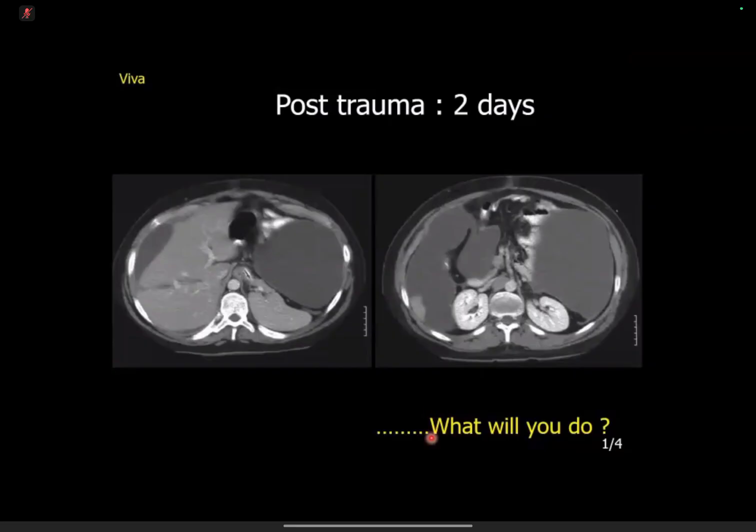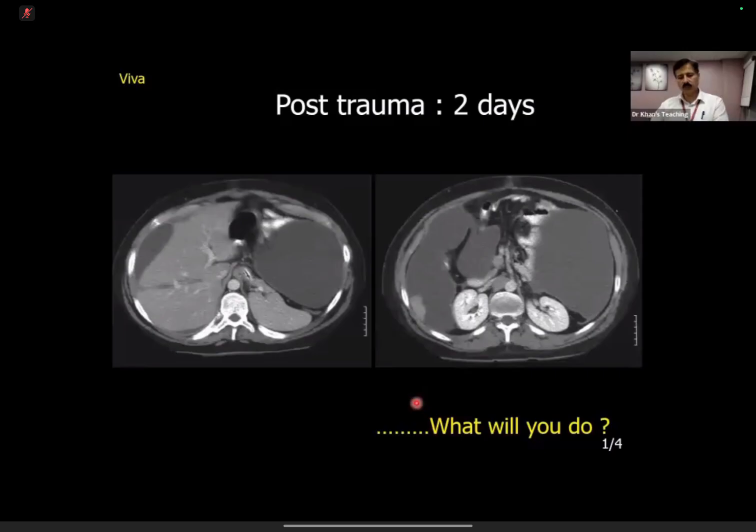the density of the bleeding is not that. After 2 days, obviously in my day-to-day practice, I would check the Hounsfield unit, but there's a lot of fluid. This was not hemorrhage. This was not at all hemorrhage. This was like water. Okay, so there's a lot of loculated effusion. I'm worried about loculated ascites for whatever reason, whether the patient has got some pre-existing disease causing this.